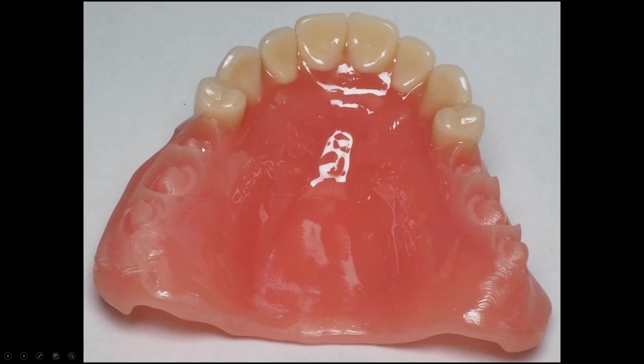So you would prime these surfaces, you would prime the tooth, and then what I use, there's numerous things you could use, but I just use the actual 3D printing resin. So you've got your pink resin. I just take some of that wet and I wet the interior of this, leave a few drops of it in there, and then take my tooth.